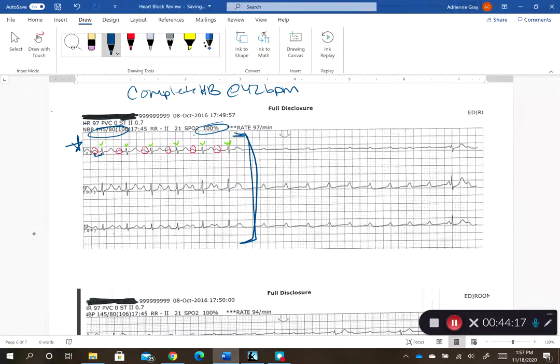All right, so now I know there's some type of heart block going on because this is a real goofy rhythm, right? So I'm just going to mark my PR intervals. This is lead 1, which is okay. We can look at lead 1. This is lead 2 down here, where the PR intervals may be a little bit easier to see because my P waves are a little bit bigger. So I'll mark them down there as well.